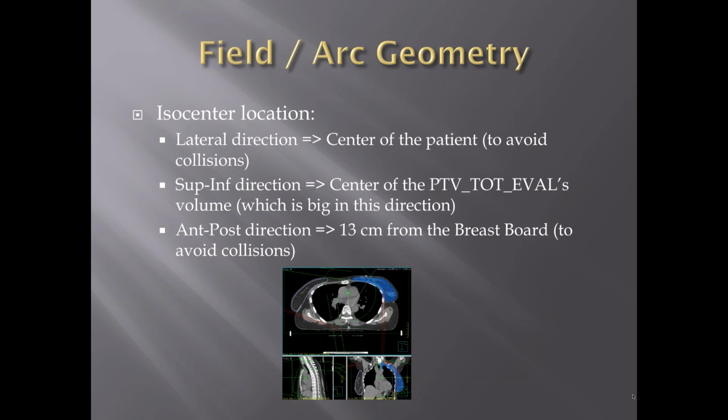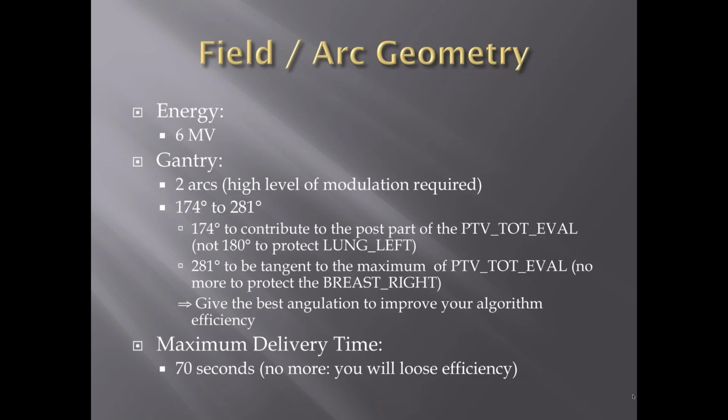Now I will talk to you about my ballistic. So I used 2 arcs with 6 megavolt energy.